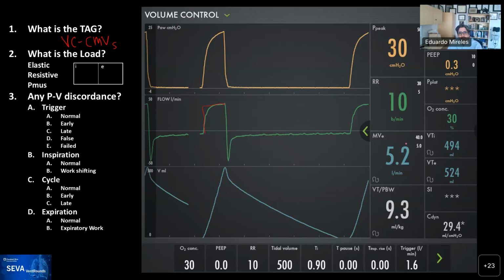And Rob, you can correct me if you hear anything. But essentially, the ventilator, if we take this out, would show you the real waveform, which is a square waveform. And we know that too because the information that we see on this waveform is similar to what we would be seeing on the pressure waveform if it was a square waveform.